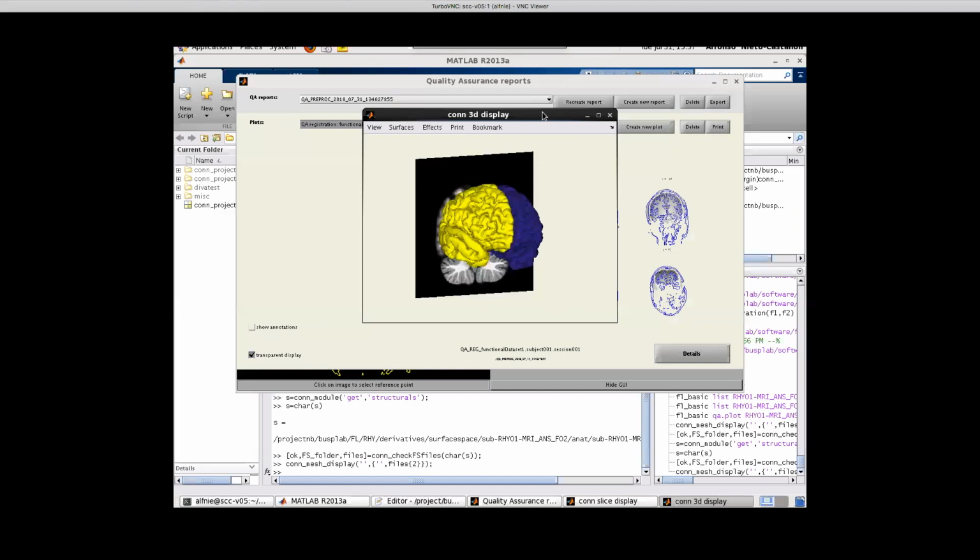I have not loaded up a surface-based contrast map, but maybe I'll do that after this. Okay. But going back to your original question, ultimately that's the check that you want to have. You want to be able to very easily take the individual contrast, say speech minus baseline or whatever it happens to be, and then look at them on each individual surface, right?